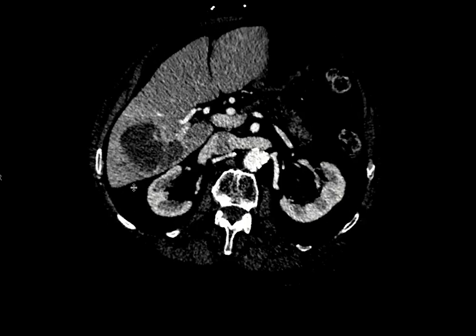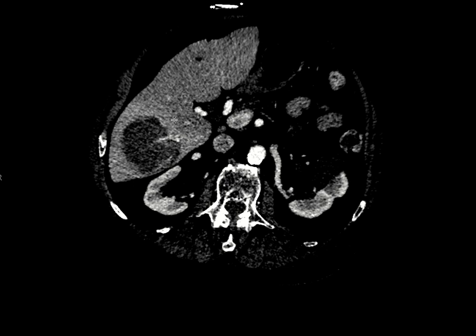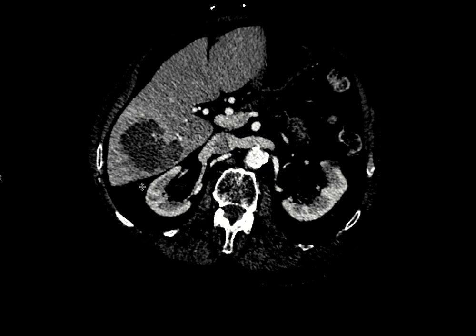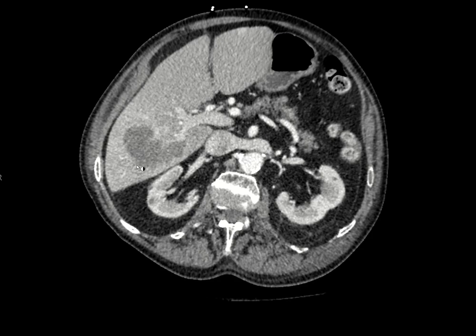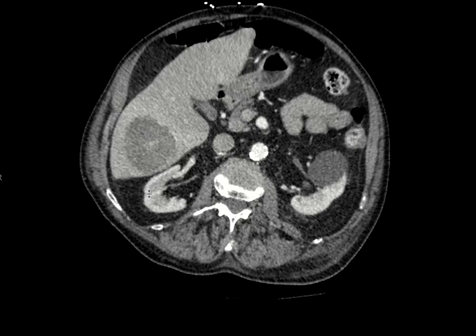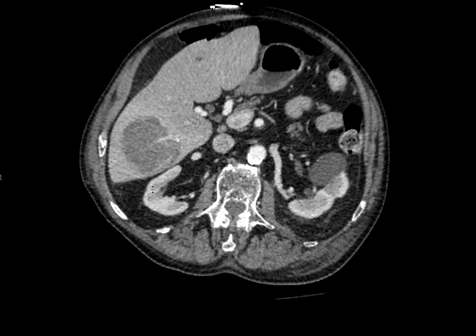The other thing that kind of supports this being an abscess is you can see the hyperemia involving the adjacent liver, which can be seen from inflammatory responses. So this was actually thought to represent metastatic disease rather than an abscess. Abscess was not put in the differential. So this patient actually went for a biopsy.